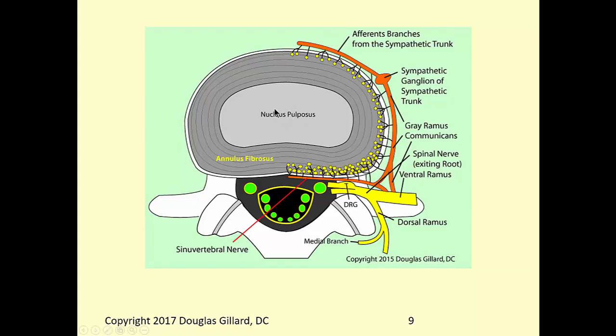So this is the L5 disc. How do I know that? These guys right here. We'll talk about those in a minute. But let's do some anatomy. So if this is L5 disc level cut, what's this? L5 pedicle, this. L5 transverse process, this. Careful. That's coming up from beneath. That's the S1 superior articular process. Everything else is L5: lamina, inferior articular process, spinous process cut off.